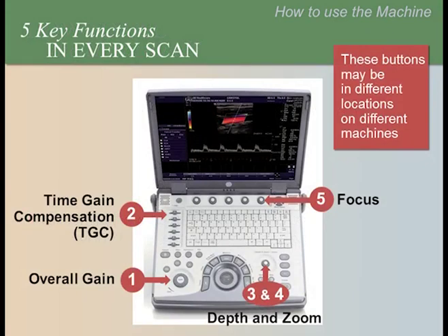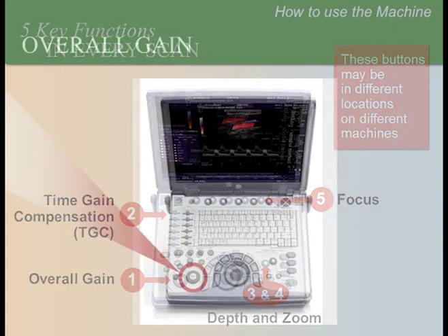For the ultrasound trainers, please face your demo machine towards the participants so they can clearly see these controls. Please locate each of these controls: overall gain, time gain compensation or TGC, depth, zoom, and focus. Now we will learn about each of these controls.